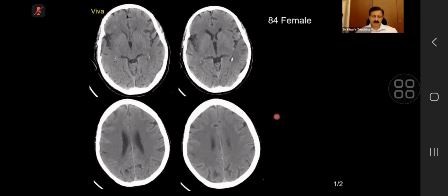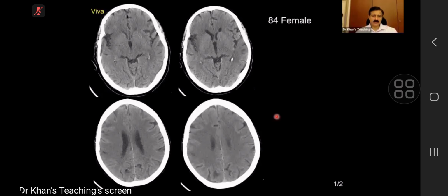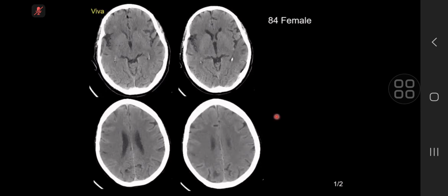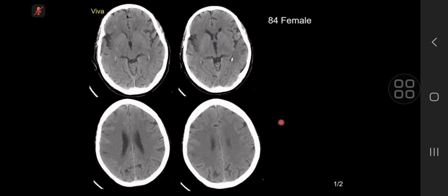Where is the infarction here? Candidate 7. So I can see an area of, it's a right occipital lobe. Occipital lobe. It's actually quite high. Parietal lobe. Look at the insula, please. So there's a right MCA dot sign. Okay. And what about the insula itself? So there is an insular ribbon sign as well on the right side.